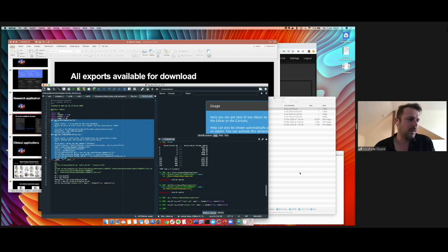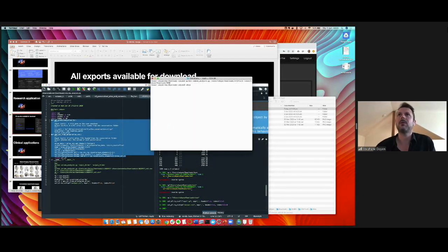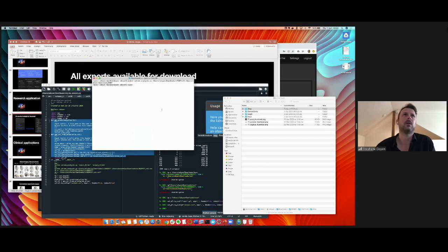So all the heavy lifting and the complicated pre-processing has been done for you. It's there and available in that folder. All you need to do next is just to create these few lines of code to start reprocessing it to add to your research paper. And I'll show you here. I've got this folder here, and I'm just going to run this code there.